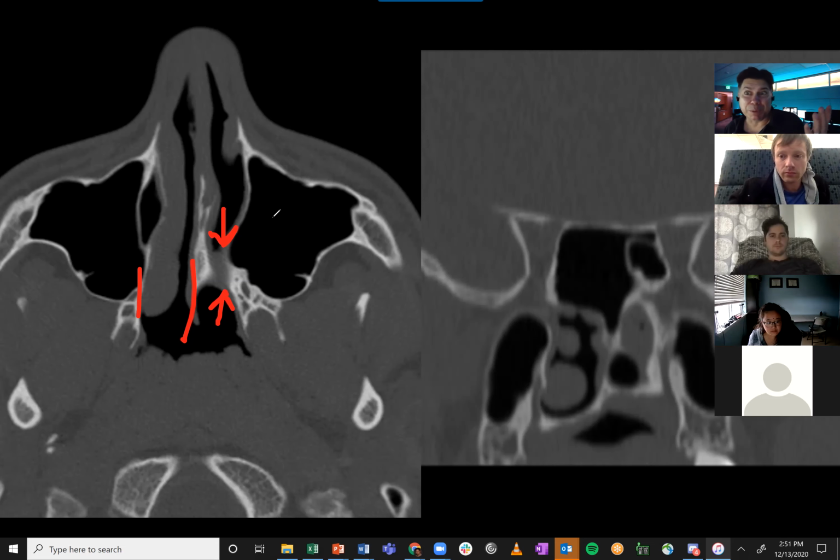One side never opened up. So if you do a lot of pediatric cases, you may see things like this obstruction. Maybe they tried to pass the nasogastric tube on that side and they couldn't get it through. So we do the CT and we look for that narrowing. So we might talk about a choanal atresia or piriform aperture atresia in that case. Good. Okay, next case.